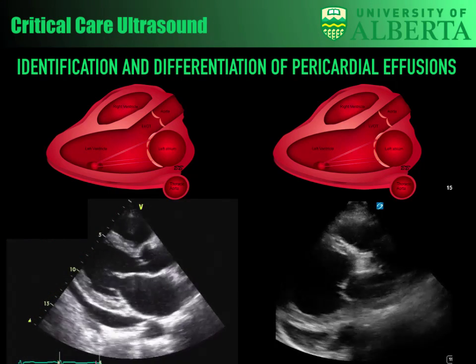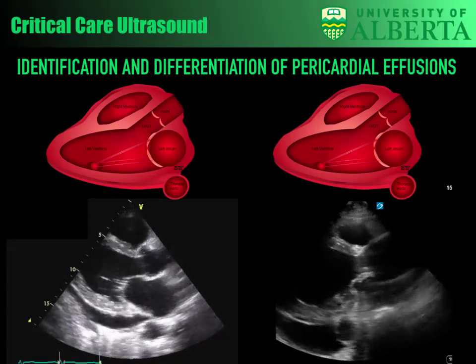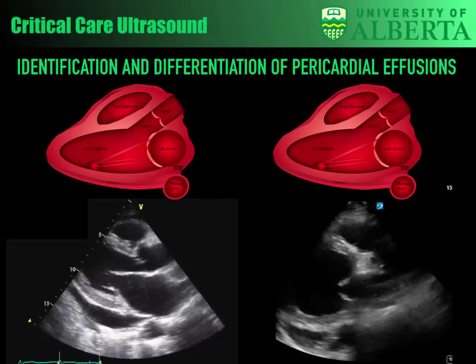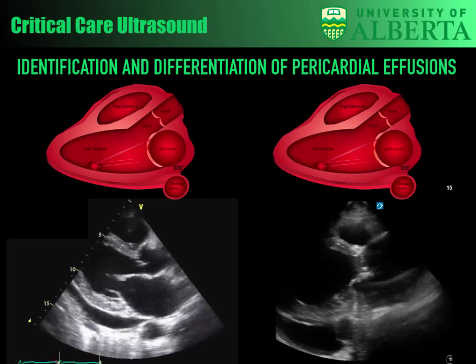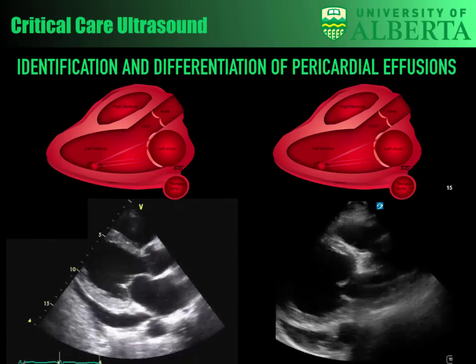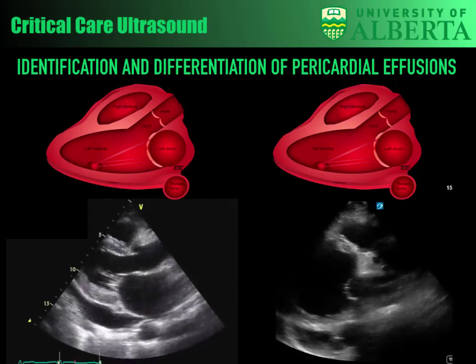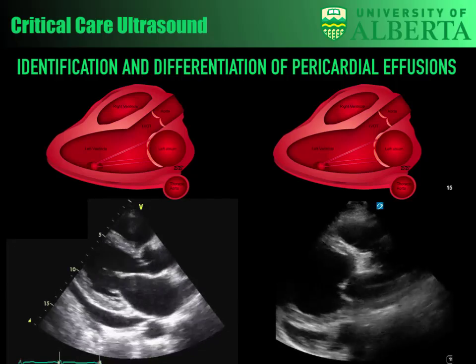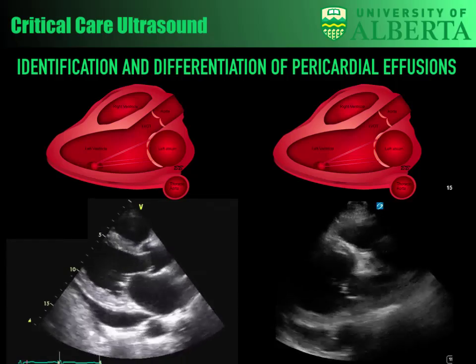So we're comparing two parasternal long axis windows. They're obviously two different patients, but they both have very distinct features which can help us delineate whether one's pleural and whether one's pericardial. But rather than me talking, maybe someone wants to speak about what features we can use here to separate what's pleural and what's pericardial. You look at the descending aorta. It's often helpful. Excellent.